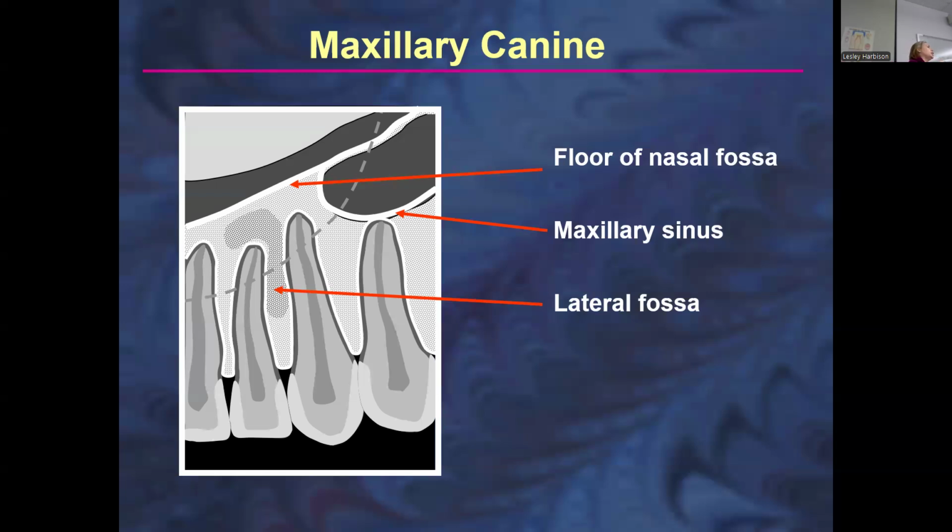But there are still usually clues. A premolar is still going to have a bulkier appearance. You potentially could see the buccal and lingual cusp, whereas the central incisors and laterals look smaller, and you don't see that depth of buccal and lingual, you just have the one incisal edge. So if you think critically through it, you can work it out, and we'll go through some pictures here.